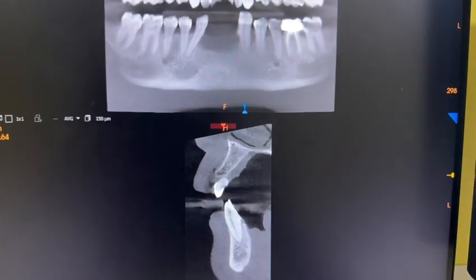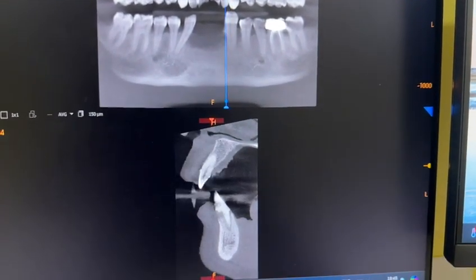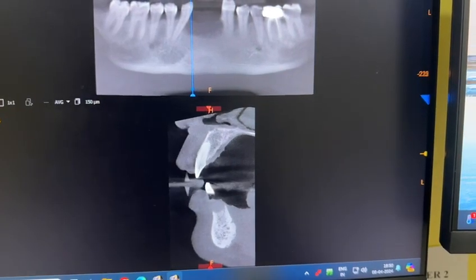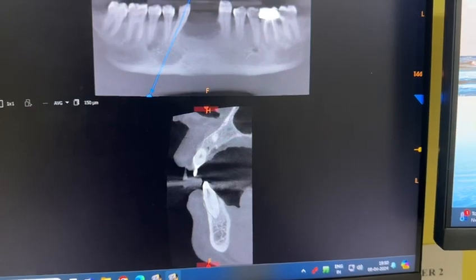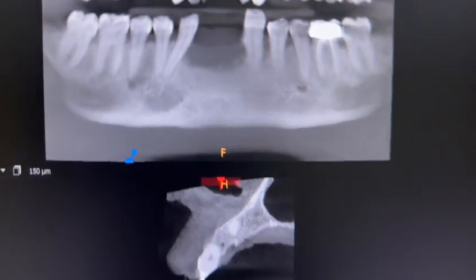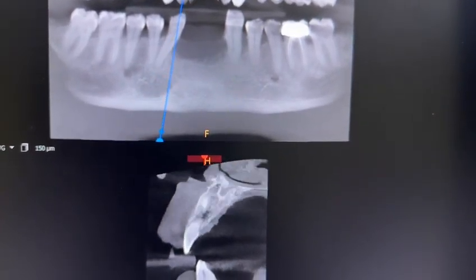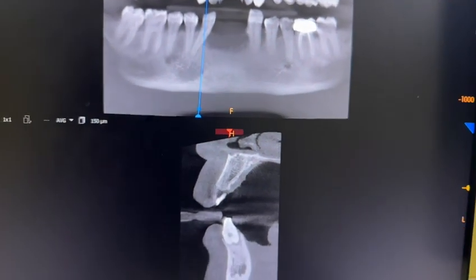This is the left canine, highly supraerupted and also mobile. The anterior mandible, 3141 area, is looking good. The thing is, anatomically the root of the canine is close to the premolars. So while placing the implant, we should not place it along the canine. It is better to place it mesially angulated to avoid damaging the premolar.